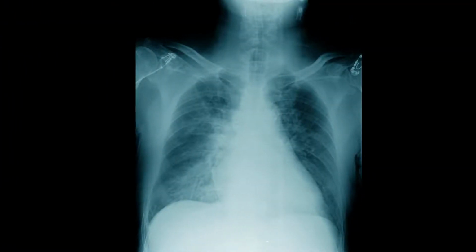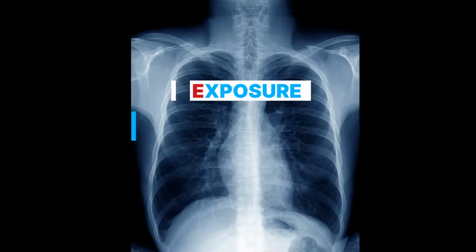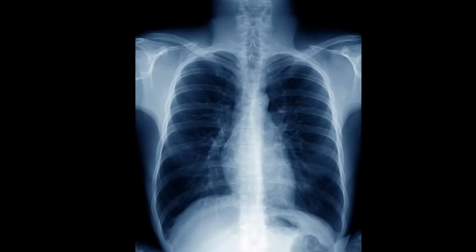In an under-penetrated film, it would be very difficult to distinguish the left hemidiaphragm compared to the spine. In addition, the lung tissue behind the heart won't be able to be assessed clearly. The last step of the RIPE algorithm is to determine the exposure. A good exposure means that the chest X-ray contains all of the significant areas that we want to see in order to get an adequate view.